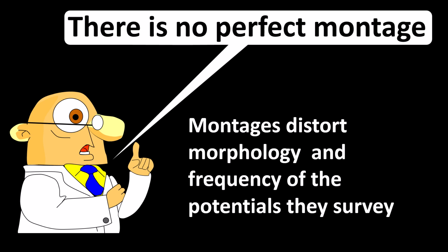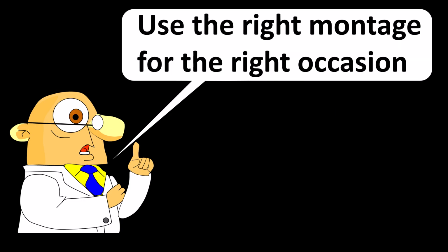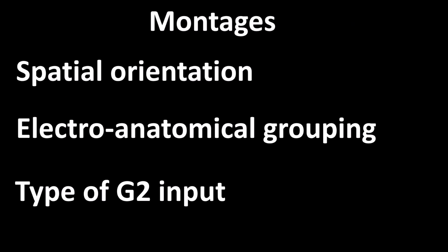As you know, montages distort the morphology and frequency of the potential they survey. Needless to say, there is no perfect montage. So, the best we can hope for is to use the right montage for the right occasion. Montages can be classified in many ways. In this frame, I have listed 3 classifications.